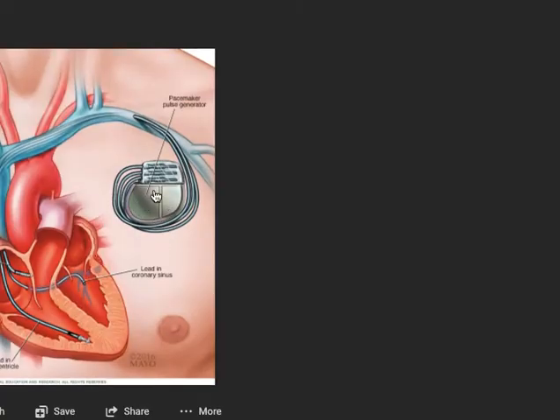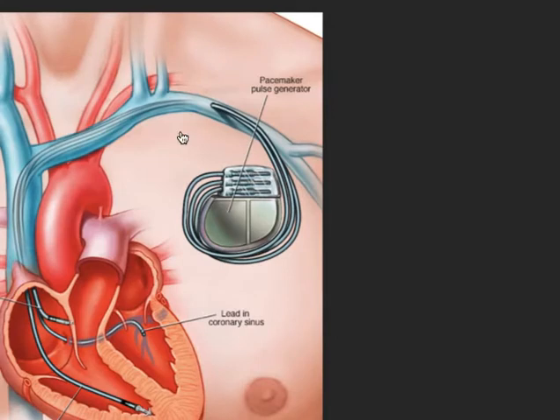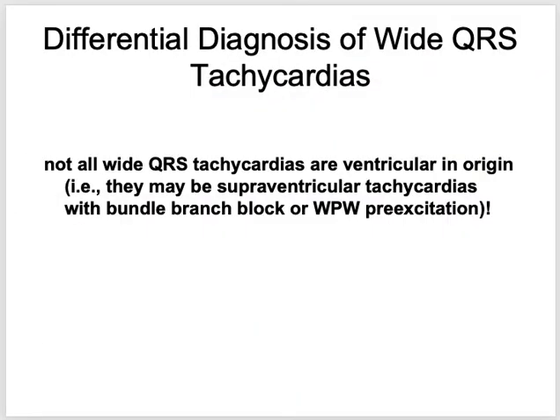You can see over here the wires going inside the heart; they are the ones delivering the electrical activity, and the heart is contracting. This is called a pacemaker.